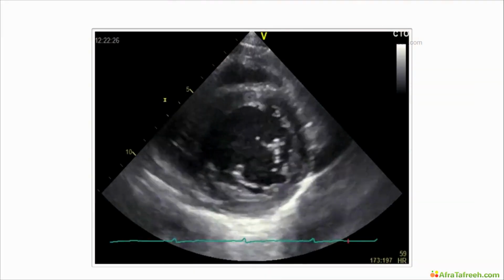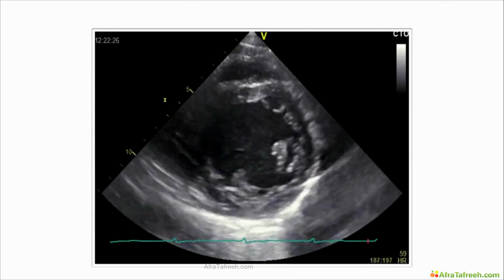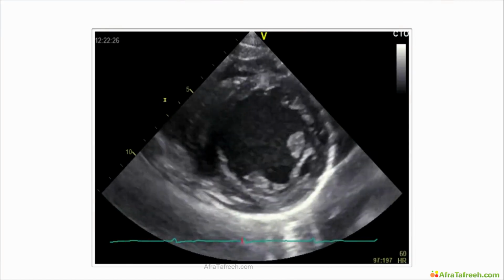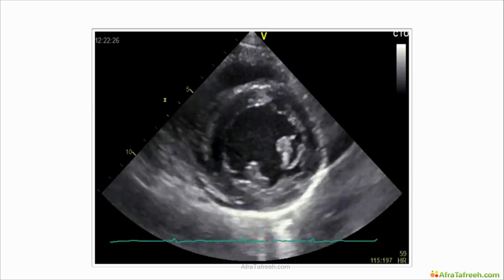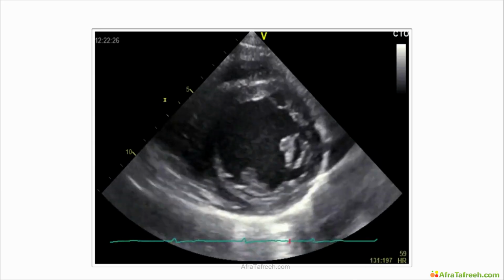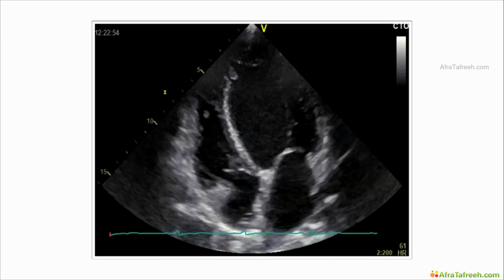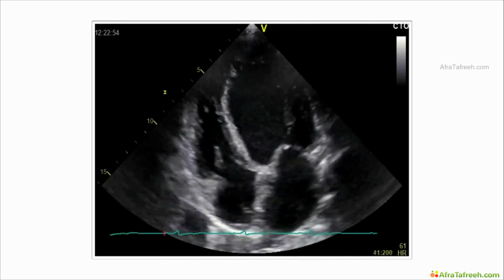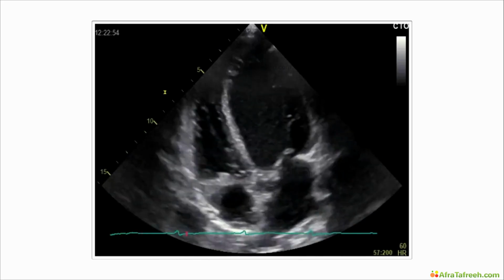Let's take a look at George. This is George. He never really had any symptoms. He just went to the doctor to get a normal medical checkup. They found an abnormal ECG with very minor ST-T segment alterations, and then they performed an echo and they found this here. I guess you will realize that the left ventricle function is diffusely reduced. And if you look at the four-chamber view, you can really appreciate that the ventricle is dilated. Now, the patient did not have any symptoms.